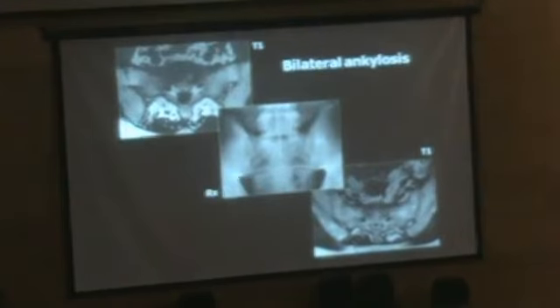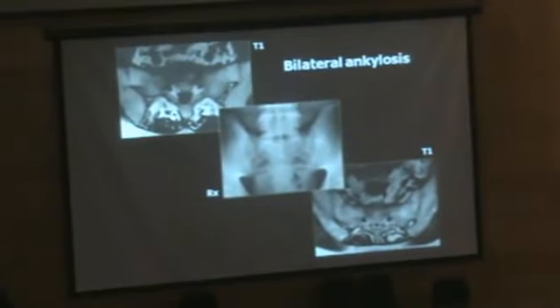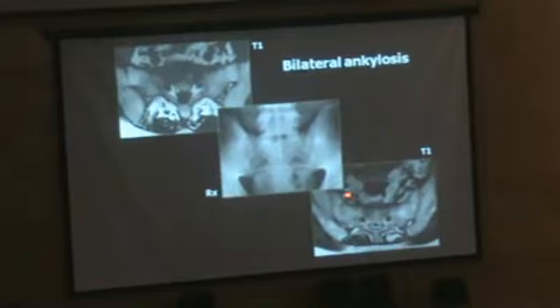And this is an example to show you the end stage. This is very easy to diagnose, but no one wants to diagnose the patient in that stage. This is very bad. This is a stage that all these drugs we know won't have any more effect on the natural history of disease. We want to diagnose those in the other slides I showed you, when we see the very early stages of inflammation. So this is ankylosis. We don't see the sacroiliac joints anymore, and you can see on the MRI as well, areas of ankylosis, meaning fusion of the bone, so we cannot see very well the joint, the joint space itself.